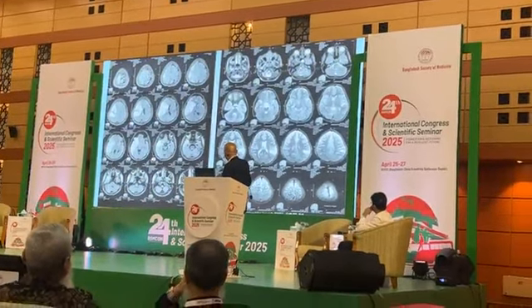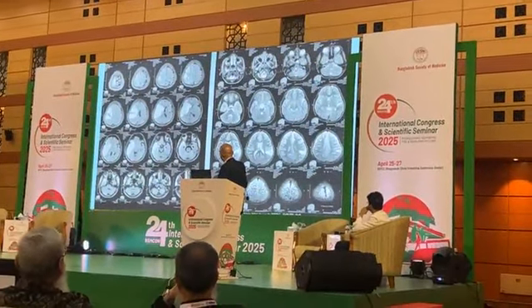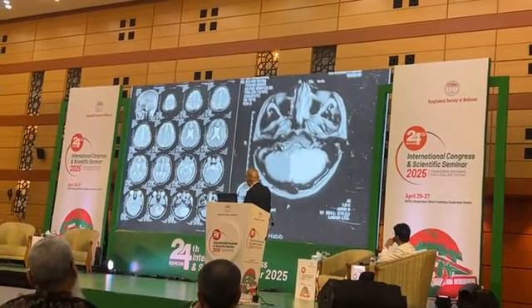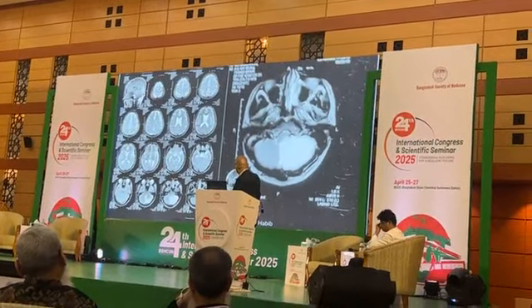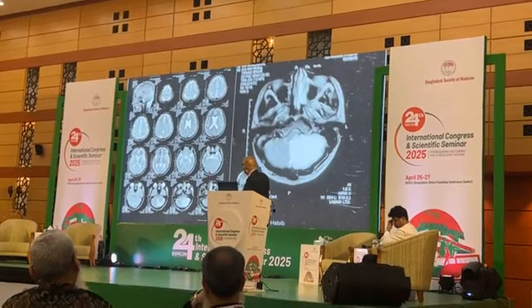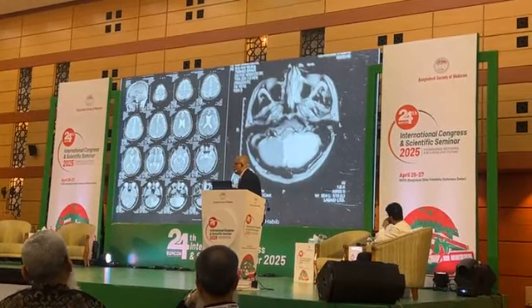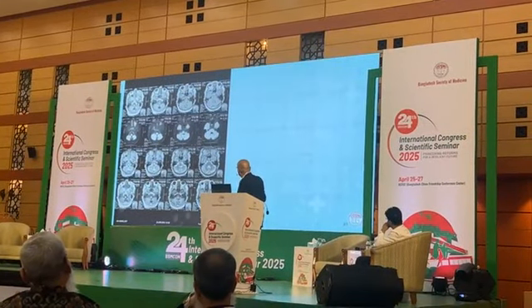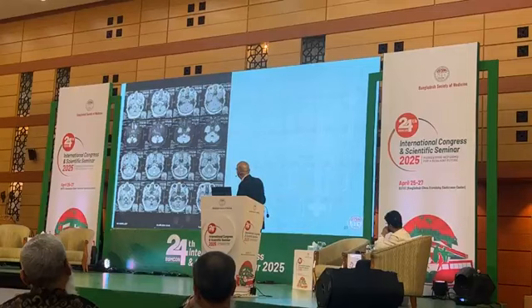This is a branch infarct on the left middle cerebral artery. But this is again left cerebellar or superior cerebellar artery territory infarct. We could see all these three with CT scan, all right. But this is something special that MRI can see.